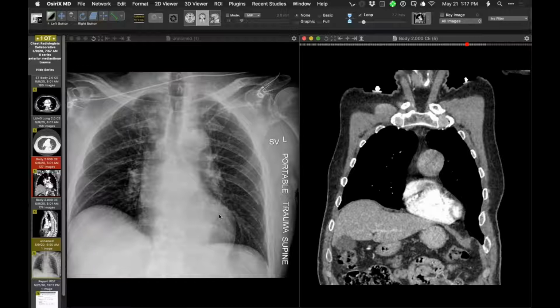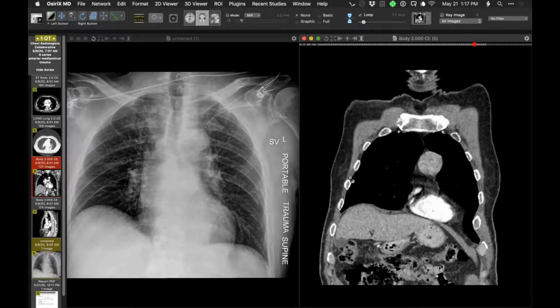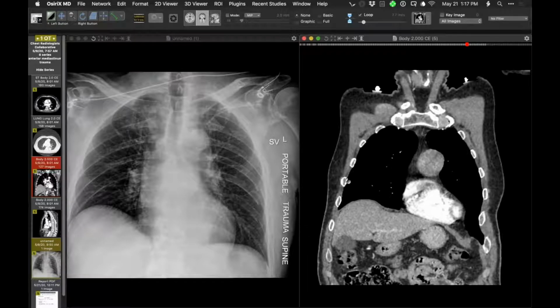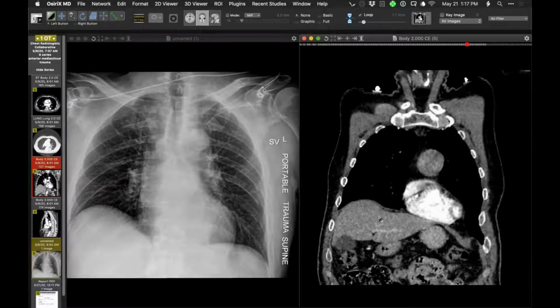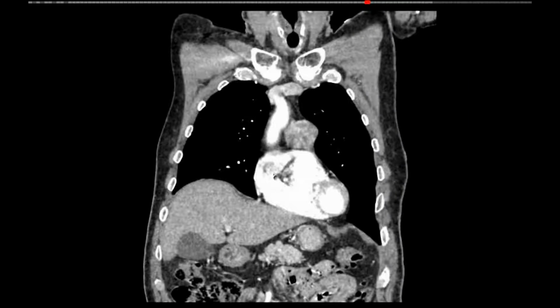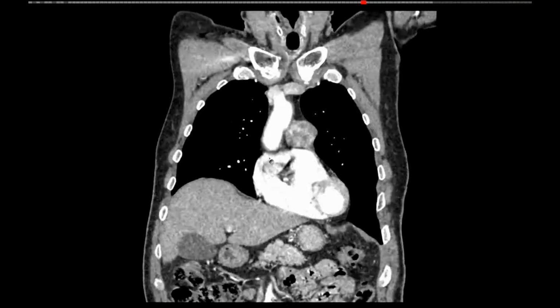I think in the context of screening, one diagnoses thymomas around 5% of the time as an incidental finding. Usually they're small, of course, but not surprising, really. My experience is we find them more often when we're not looking for them than when we are. I don't know if that's been yours. Yeah, it's kind of hypervascular too. If it were a younger patient, you might think that it could be a paraganglioma. It's vascular, not super paraganglioma-like, but it is enhancing somewhat heterogeneously.